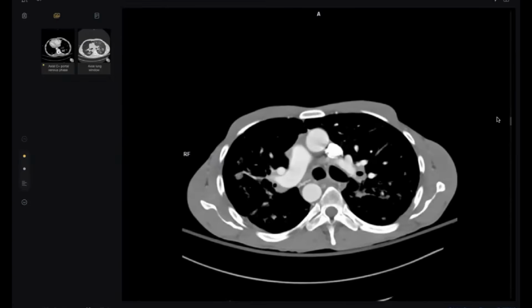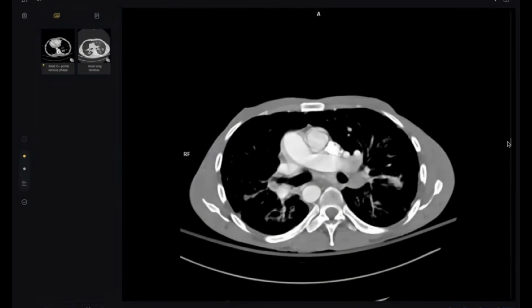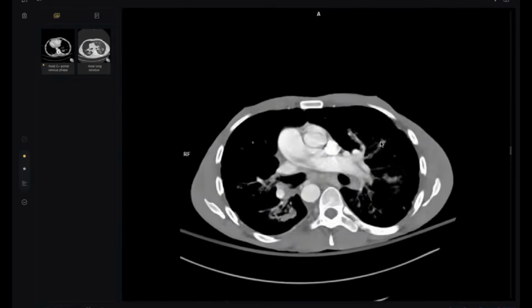It arises from the aorta. So look here at the mediastinum. At least there is some abnormal vasculature here. Yes, the oral exam depends on a lot of guessing. Why? You have only two causes of hemoptysis here, and you find abnormal vasculature in the mediastinum.